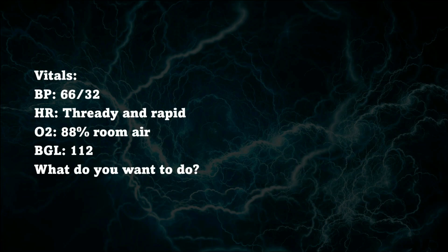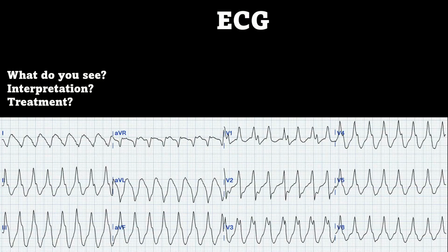But why is he unstable, or why is he sick? We need to quickly identify the underlying cause, and the next step is going to be obtaining an EKG. Alrighty, so here is his EKG. Pause the video and determine what you think this rhythm is.